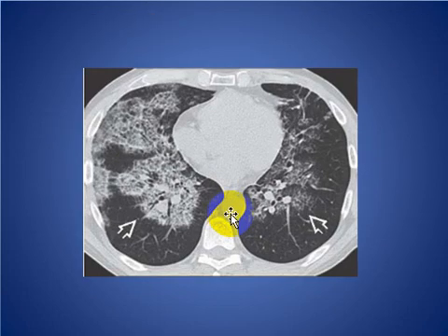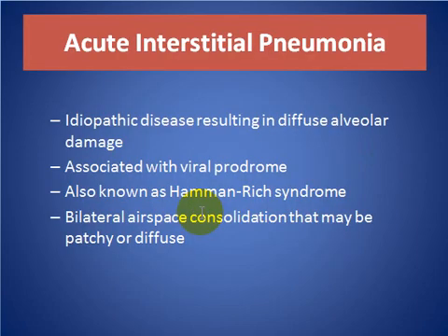Here we see a high-resolution non-contrast axial CT scan with bilateral ground glass appearance with interlobular septal thickening, giving the appearance of crazy paving. And this is distributed centrally with peripheral sparing, but it is not specific, and it is consistent with pulmonary alveolar proteinosis.